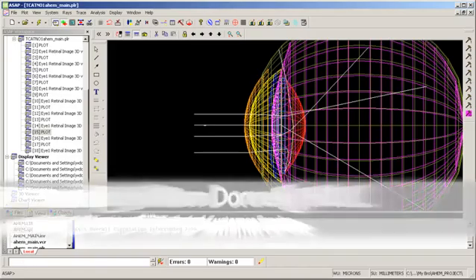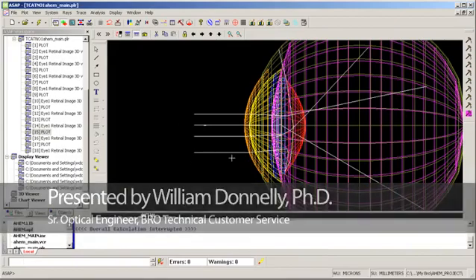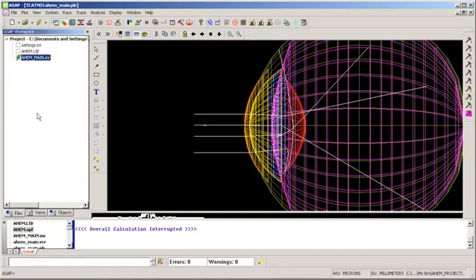Lens cataract can be modeled using AHEM. So the image we're looking at right now is a few rays being traced into the eye and being scattered around by a cataractous volume within the eye. So let's load up a settings file of how we might set this up.